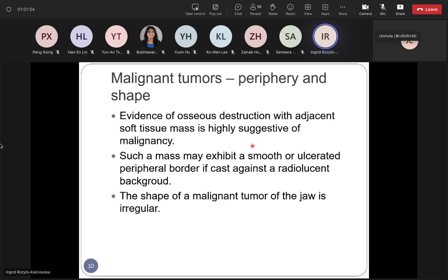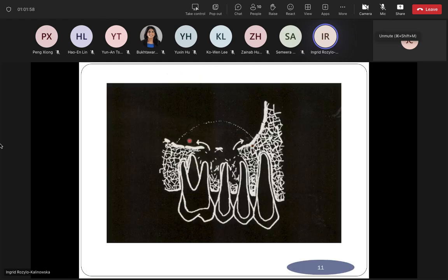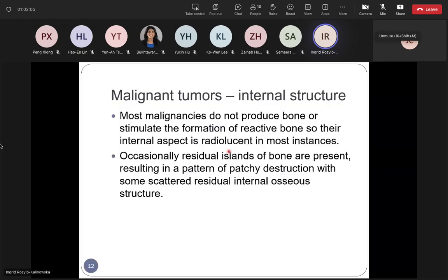The lesion can grow from the maxilla into the maxillary sinus, can destroy the floor of the maxillary sinus, and against the air in the sinus, it may look like radiopacity, which is a matter of contrast, and I think I have already explained it to you regarding the extrinsic cysts in maxillary sinuses last week.